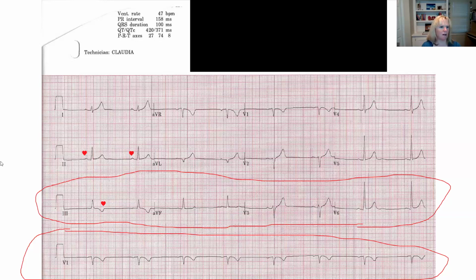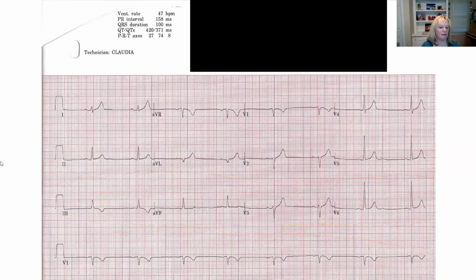Actually, I'm sorry, this is wrong. This is not a rhythm strip. It's only V1. I'm sorry, I did that wrong. This is your rhythm strip, but I would not use this because you can't see the P waves very well.